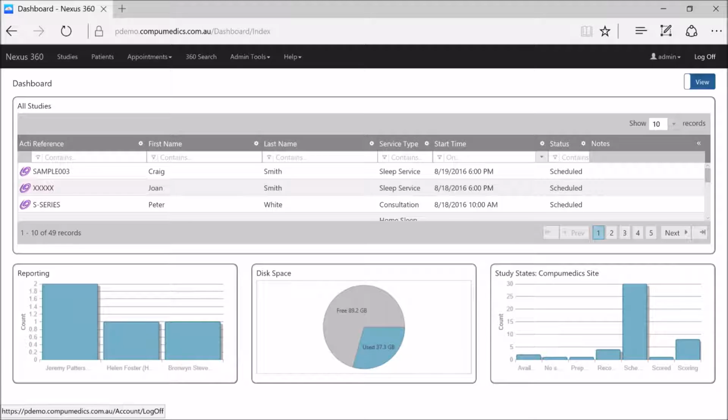And when we first log in, we'll see these dashboards appear, which are covered by another tutorial teaching you how to set these up and configure them per individual user accounts. But the topic of today's tutorial is explaining the group permissions and adding new users.